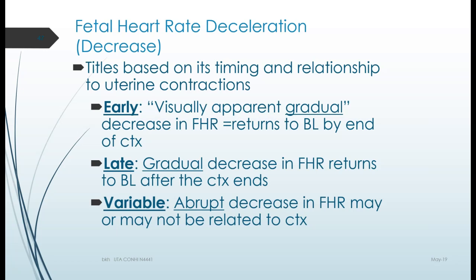The heart rate reaches its lowest point typically at the peak of the contraction. As the contraction starts to ease off, the fetal heart rate goes back up to its baseline. It is back at its baseline by the time the contraction's over. If they mirror each other, that's an early deceleration.